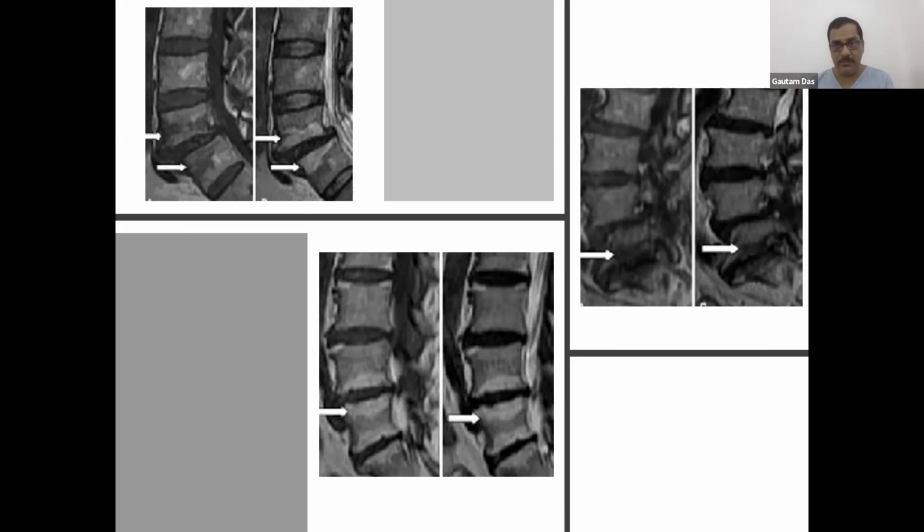No water, sometimes we call it dehydration, sometimes we call it sclerosed fibrous tissue, because in some tissues there is no water at all. So it doesn't mean that it is dehydration. Dehydration is a specific condition. So no water means it looks black in T2. But remember that fat can also look white in T2, even though there is no water. So in T2, both fat and water will look white. And what will be looking black? Where there is no fat and no water, that will be looking black.